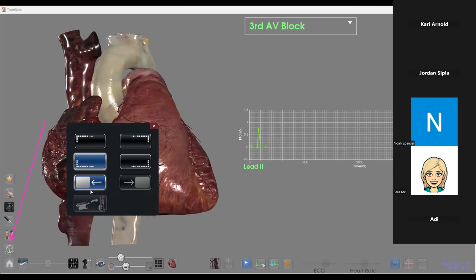This is also the menu where we go to switch to vertical mode, but in table 11, functional anatomy is not compatible with our vertical mode. Functional anatomy can only be used in the horizontal mode, which is why you'll see it not available in here.